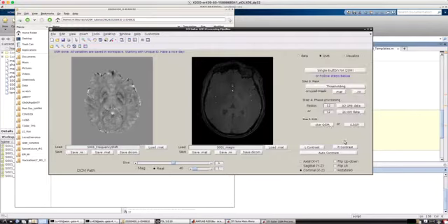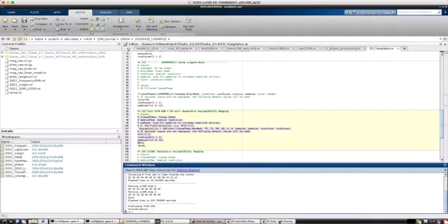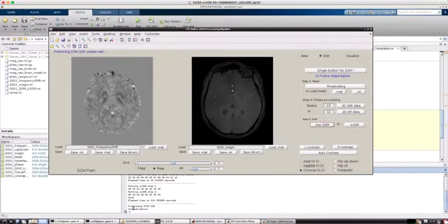As I said, you can also calculate the QSM maps using the star QSM method, and I will just run this very quickly to see what happens. You see that in your command line it says performing star QSM and initialization, and it will take much less time in this case to compute the maps. And just wait a second, then you'll see what the differences are.